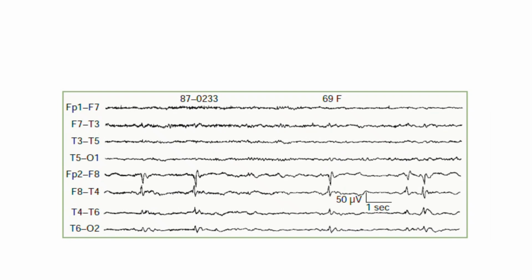In stark contrast to the generalized, symmetrical patterns seen in primary generalized epilepsy, this tracing demonstrates a classic focal, localization-related abnormality. Here is how to systematically read this recording to pinpoint the structural lesion causing this patient's epilepsy. 1. The temporal montage setup.